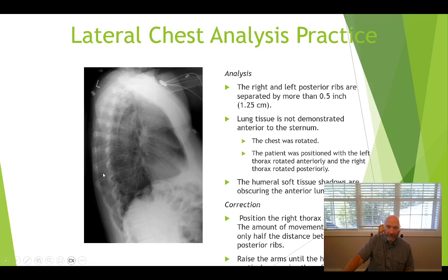A lot of rotation on this one. I'd said that a half an inch was probably acceptable in most hospitals. In this case, that's pretty extreme. The question is, what's going on with this patient? And I'll say this over and over again throughout this semester and next semester, especially this semester. Next semester, a lot of skulls.